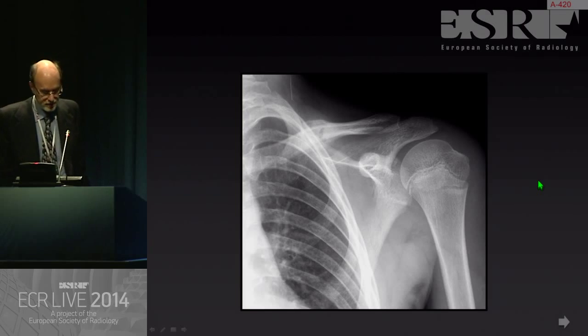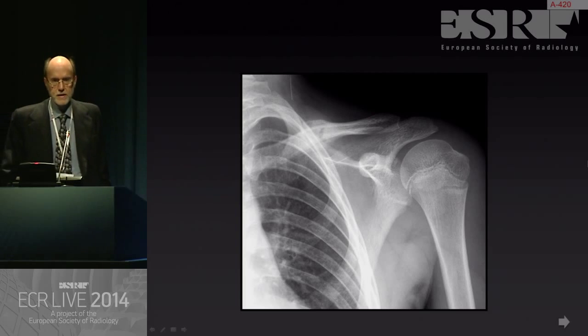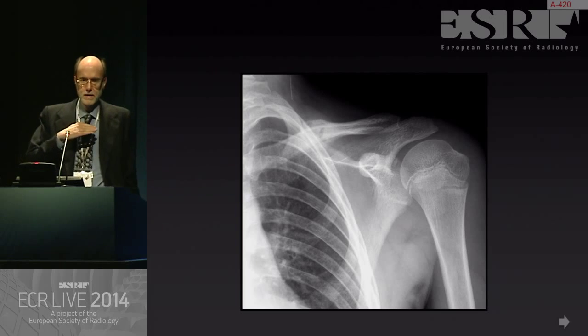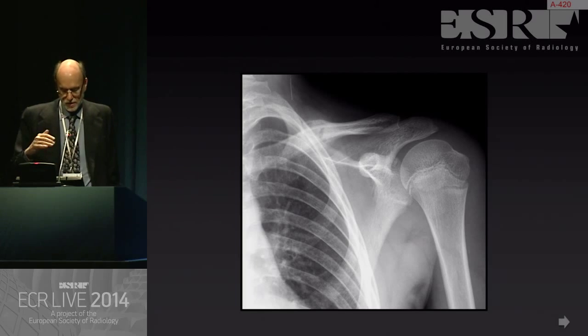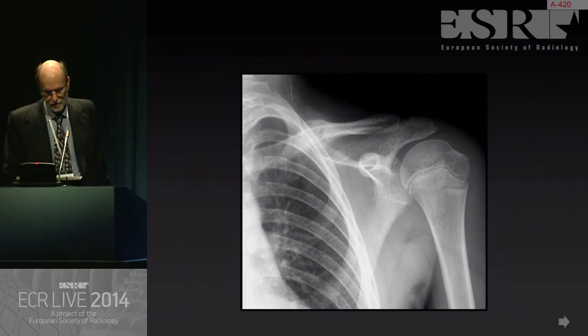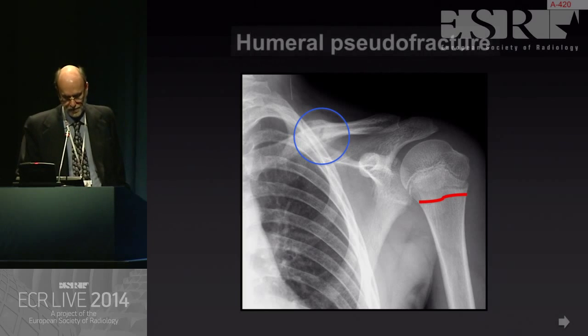The radiograph of this patient was for follow-up of this notorious callus, the clavicular callus, but the clinician asked about this radiolucent line. Of course, this is absolutely normal. This is the physis, which is not totally tangential to the X-ray beam, and we are seeing 2 lines instead of 1, and it's completely normal. This is not a fracture.